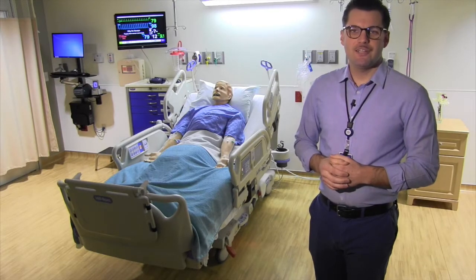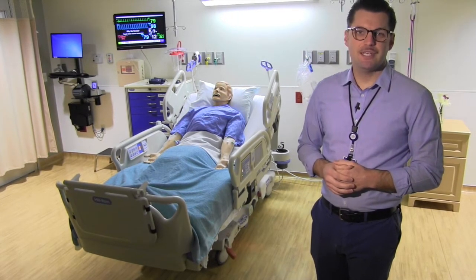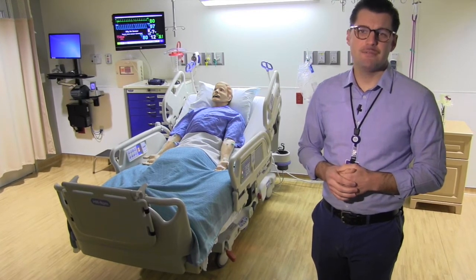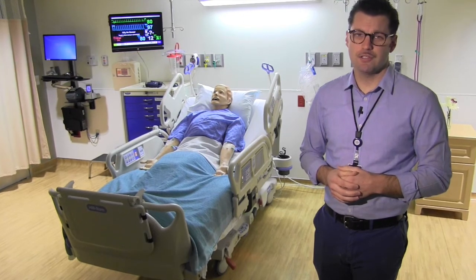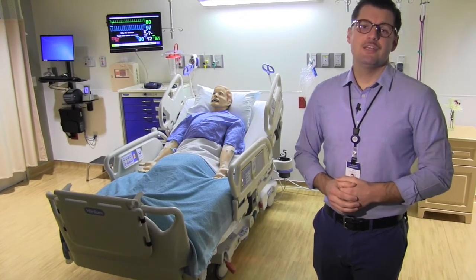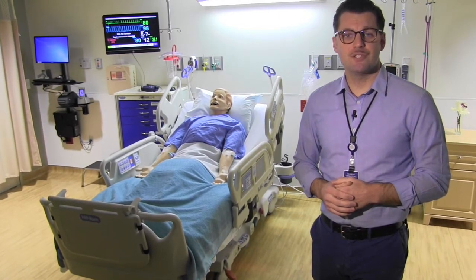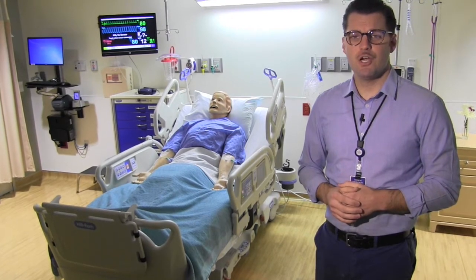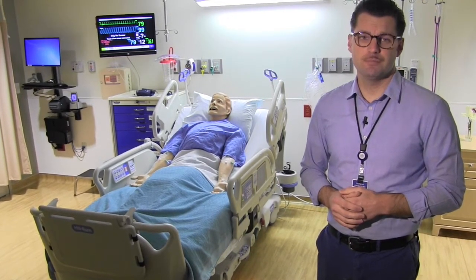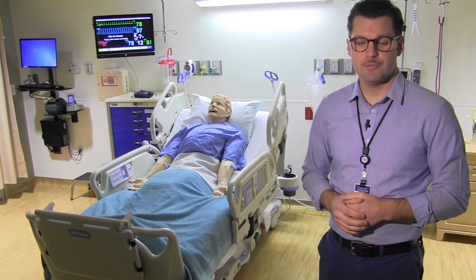Intermountain Healthcare's state-of-the-art simulation program provides healthcare workers with realistic, interactive training in cognitive and behavioral skills required for proficient clinical and non-clinical practice. To make each learning opportunity as valuable as possible, it is important that you understand the capabilities of your patient simulator, along with the expectation for your actions during a medical simulation. This video is an introduction to the functionality of the patient simulator that you'll be working with today.